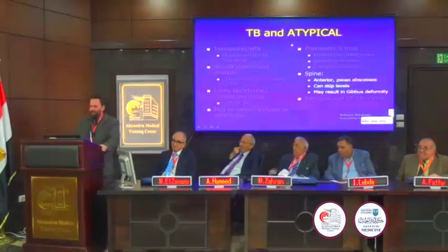No loss of joint space. Other than the osteoarthritis here, no loss of joint space, non-pyogenic arthritis. Another case of Mycobacterium marinum, complete destruction of the wrist on T1 and T2. Now in the spine, it's non-uniform, so it affects the anterior aspect of the disc space.